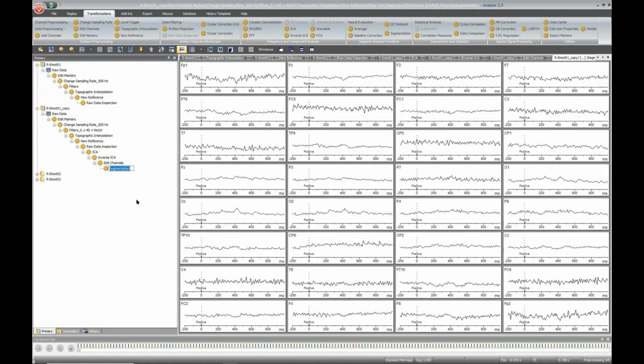And I'm going to call it segmentation positive. So in the case later on, for example, if we wanted to have the negative and the neutral, then we can rename them in the same way. And now we see our trials with a little bit of a different view.